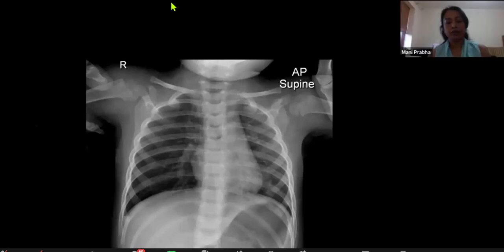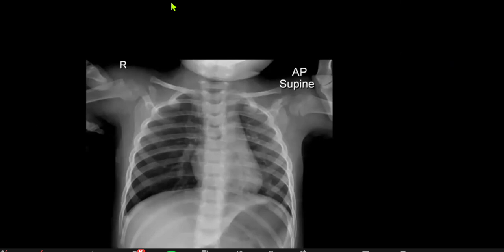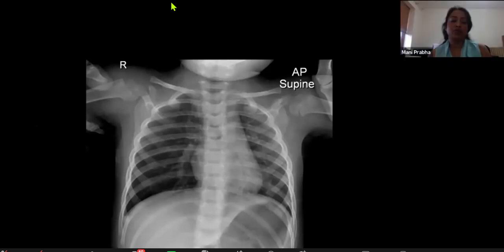Okay, next patient, next case. Okay. So I'm going to come on the findings later on once I've done with all the.